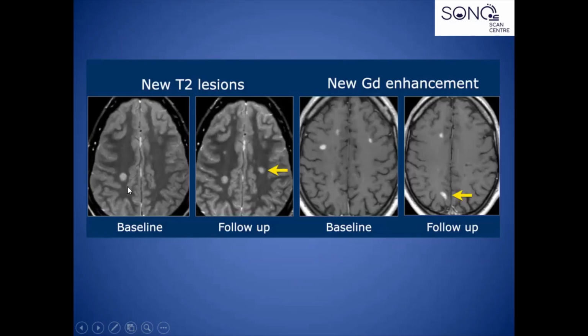In comparison, MRI definitely plays a good role. This is a baseline investigation which was done initially. There was a lesion, and this was found to be MS. But in follow-up after 3 months, there was a new lesion seen there. So comparing with the previous records definitely helps here. These are the T2 sequences. This is a contrast sequence. This is how the contrast helps here.